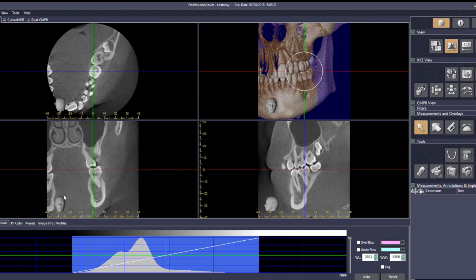If we come down here, this is coronal. We can see this is the patient facing you, which remember is the way we always look during radiology. When you take a DPT, the patient is facing you. So this is the patient's left, and this is the patient's right. Exactly the same as the panoramic. And finally here, a sagittal. A sagittal is looking through the patient from one side to the other. So from here, from left, going through the patient to right.